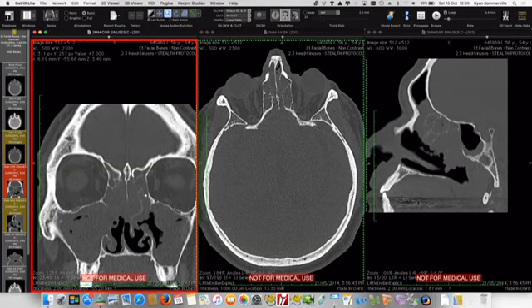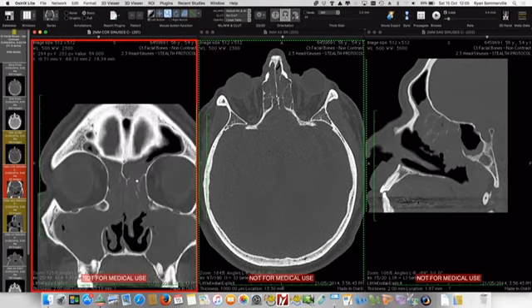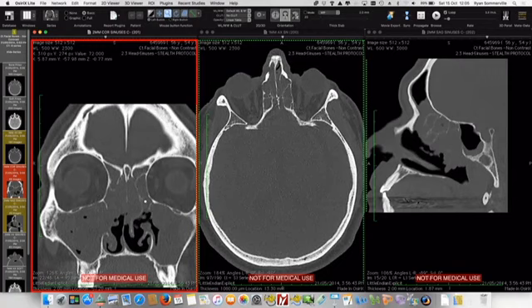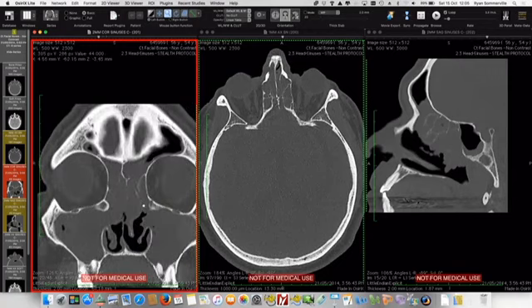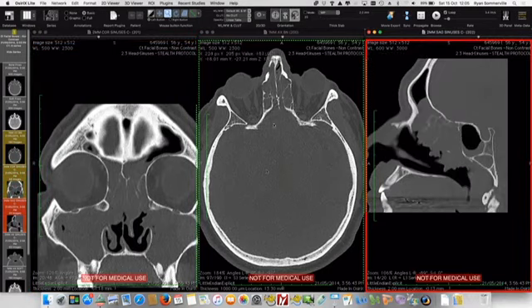So you can see that the frontal sinus drainage pathway, or the frontal sinus, we start up here, goes medial to that bulla ethmoidalis cell, lateral to the middle turbinate here, and then passes down into the infundibulum. So if we don't clear that bulla ethmoidalis cell, then you don't clear the disease. And you can see them when you look through.